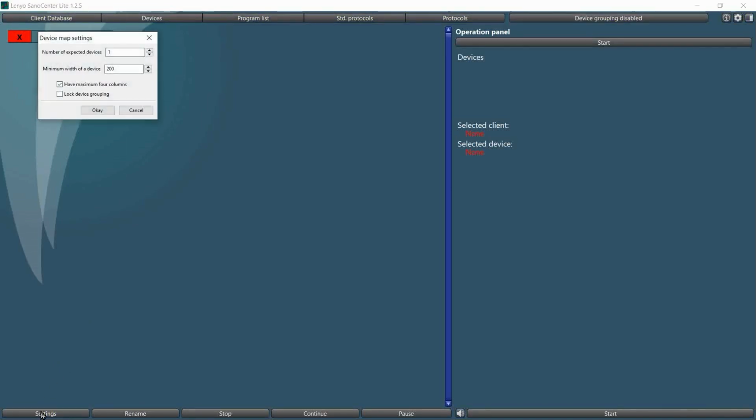In the initial setup phase, you will need to specify the number of signal generator devices that will be linked to the application. If you have acquired one set, the number of devices will be 4. With 2 sets, the number will increase to 8, and so forth. It is imperative to accurately indicate the correct number of signal generator units.